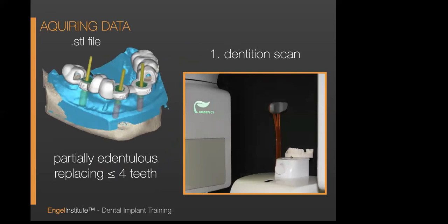All right, so now the STL file for a person coming in needing number 5 or needing number 3 and 5 goes like this. The first thing is obviously we're going to take the scan. For the STL file, we are going to capture that one of 3 ways. We must have 2 files, remember, okay?